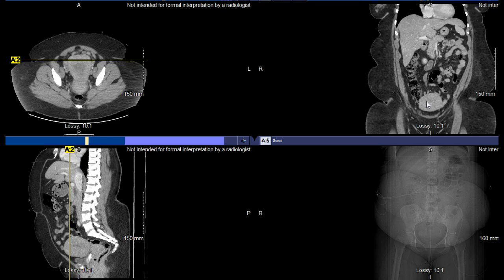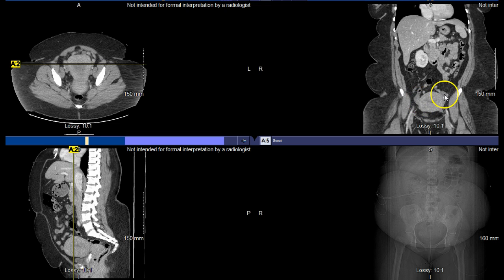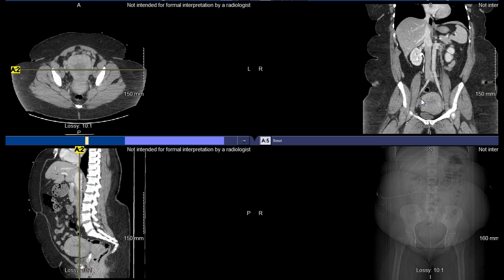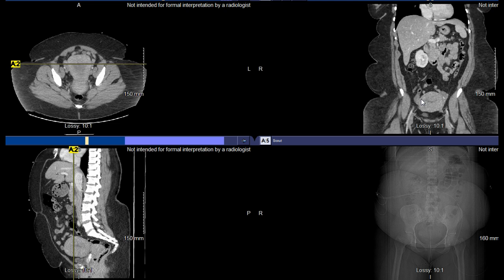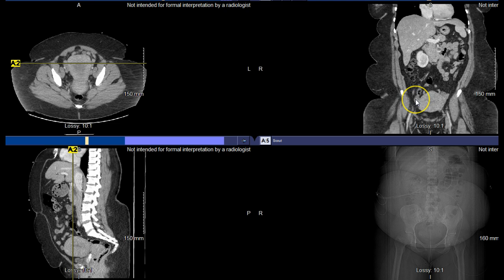But what you're seeing, nonetheless, is, pay attention to the uterus and look at the branches that are coming off of the uterus. And we know that the uterine tubes are there, so that means that we have to be close to the area of the ovaries. So in that regard, right in here would be the region of the ovaries.